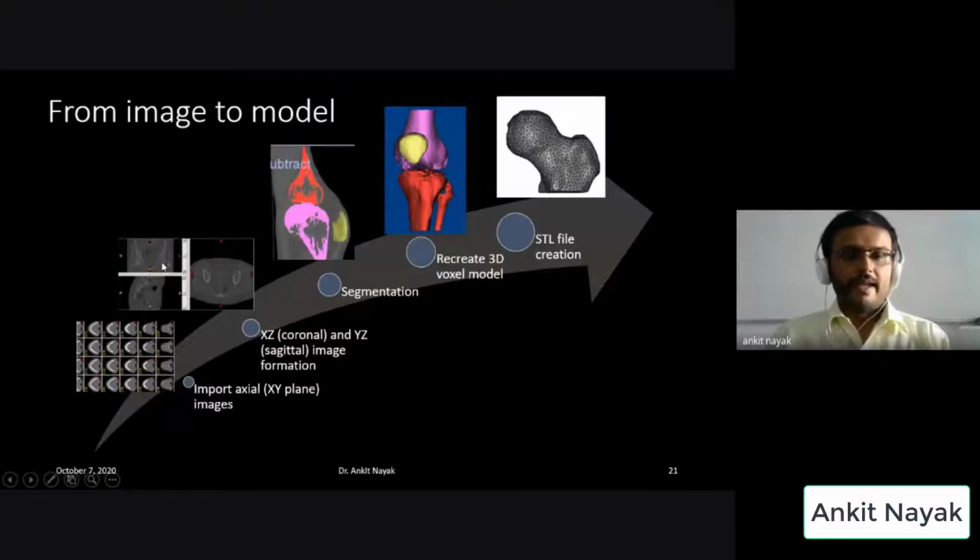From that three-dimensional matrix we can prepare the side and top view of that body. Here you can observe you will have only the top view, okay? But by arranging the different top views in a stacked form, that will form a 3D matrix, and after slicing that 3D matrix, you can generate the side view or the front view of the body. And then after generating the different views, if you have a little knowledge about human anatomy, you can do the segmentation of different body parts.